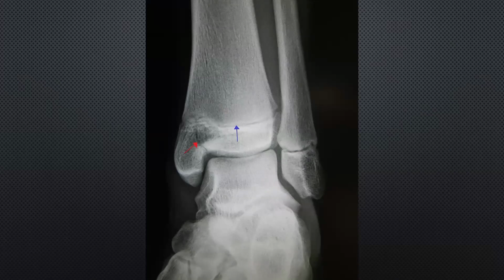The site first: this is the ankle, the distal tibia. Is the fracture through the plate? No, it is only down. Down is type 3. Lower means type 3. Salter: S1, A2, L3, lower. Clear? Yes. You can say fracture of the distal tibia, Salter-Harris type 3. Why Salter? Because it is not united yet, and the fibula is also not united.